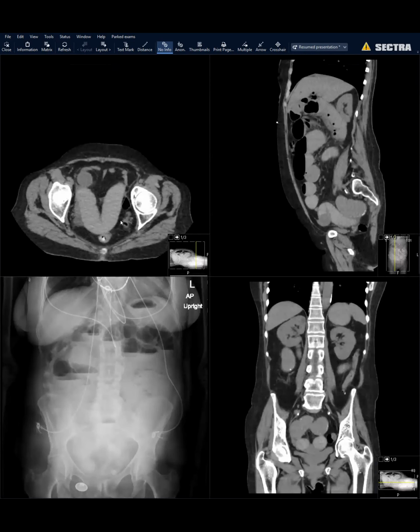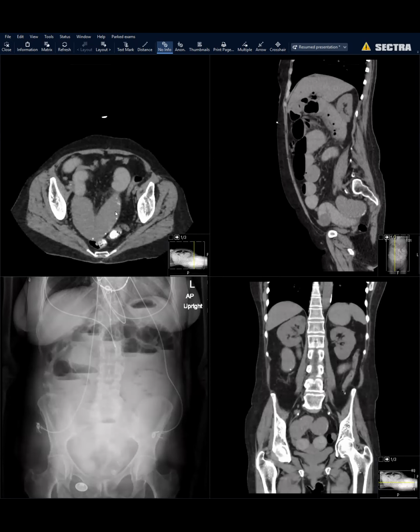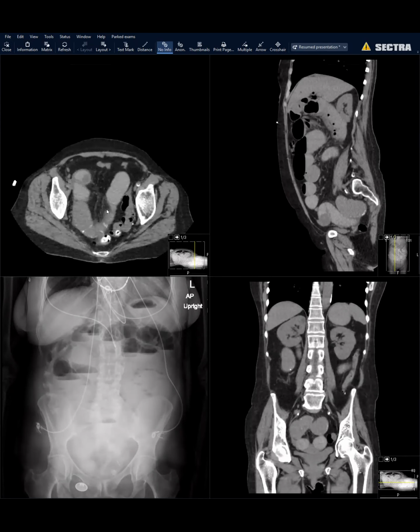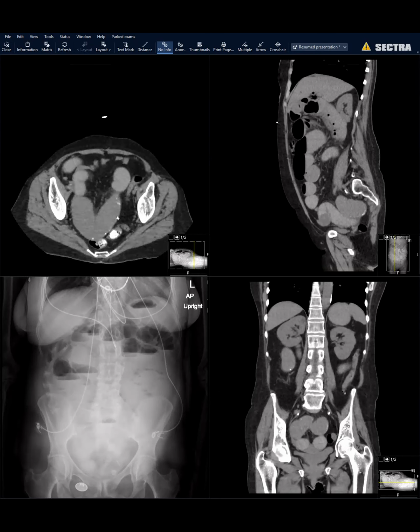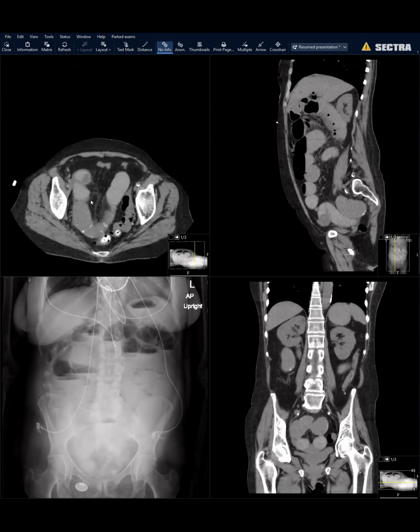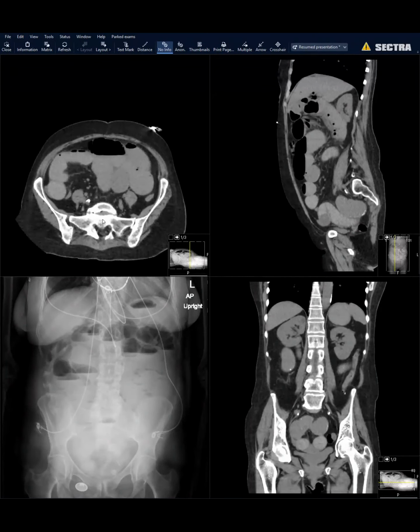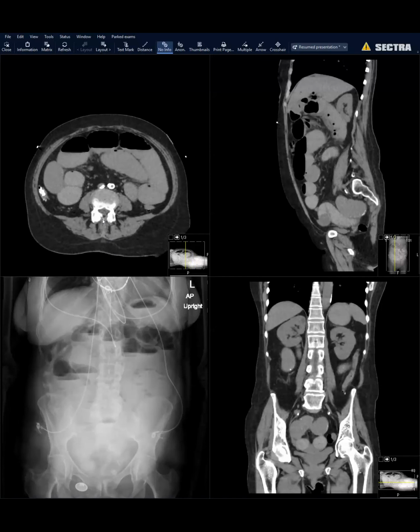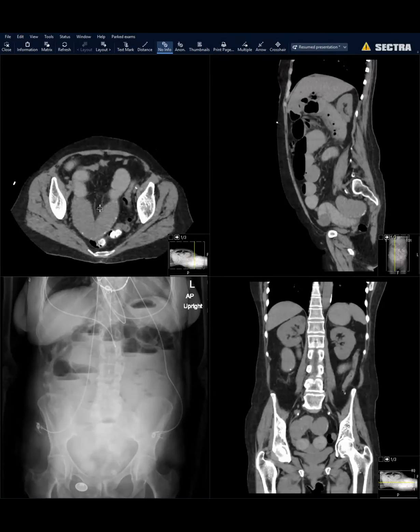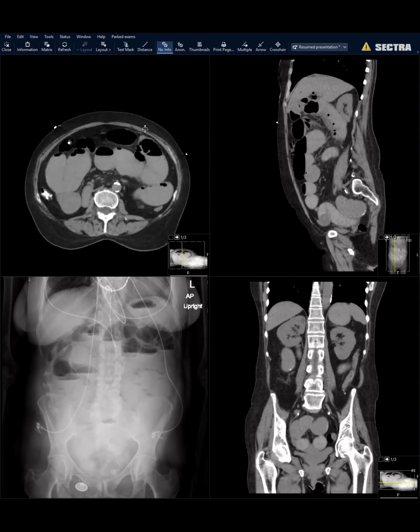I mean, not easy for residents to make this on call, but especially because there were other punctate calcifications in the small bowel wall, probably from stasis or something that they ingested, to pick out that this is a rounded filling defect. And I think Josh said there was a post-op photograph which matched exactly this stone. It's a nice SBO, gallstone ileus.